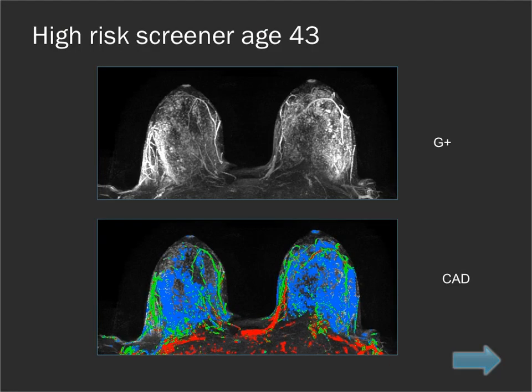So this is the sort of breast MR that if you open up, you hope that one of your colleagues will read, and you're tempted to close it again, because you can see that there is this very intense background enhancement in both breasts. But note it's very symmetrical. It all has benign progressive type kinetics here, and there's no one spot that really stands out to you from the rest. But obviously our sensitivity in this case is extremely limited.